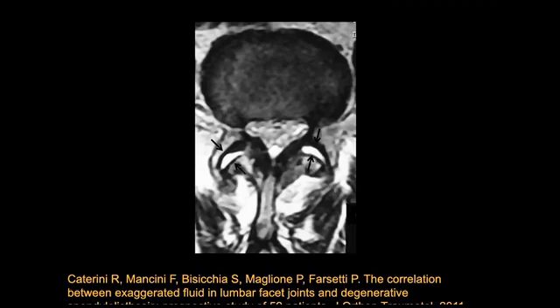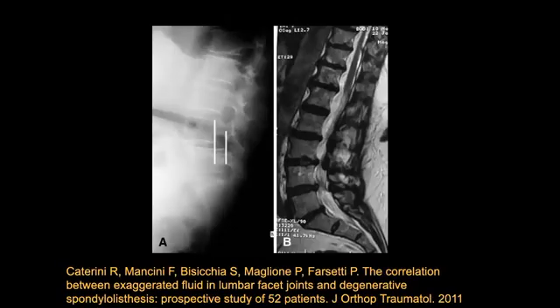We have the morphologic features of OA with osteophytosis, et cetera, but the joint looks widened or distracted, or there's a gap there. And so when you see this, you should think about a spondylolisthesis with a component of instability or hypermobility.